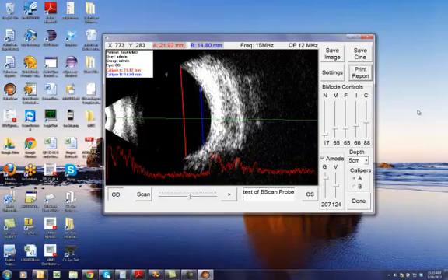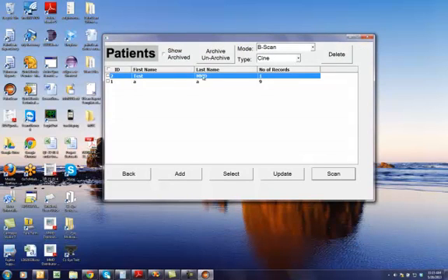And let's see, what haven't we discussed? So let's click the Done button and see the records that were generated for this test MMD patient. So if I place it in the image, you will see that there is one image, and if I put it in Cine, you will see a Cine.